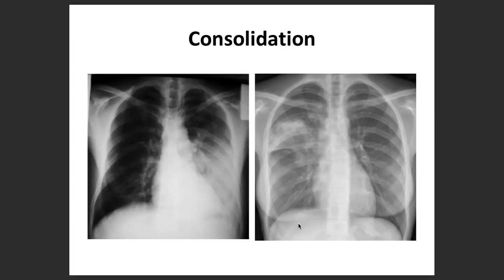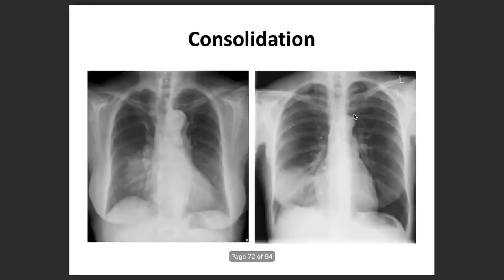So what about the consolidation? About the consolidation, you can see over here, right? And then comes the collapse. What do you notice in collapse? Anyone would like to try? Shifting of trachea. Good, good. And lung opacities.